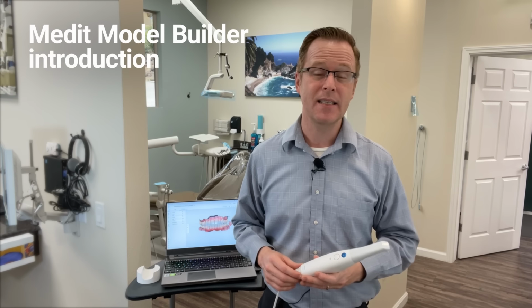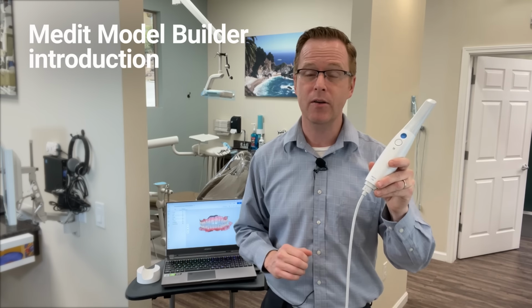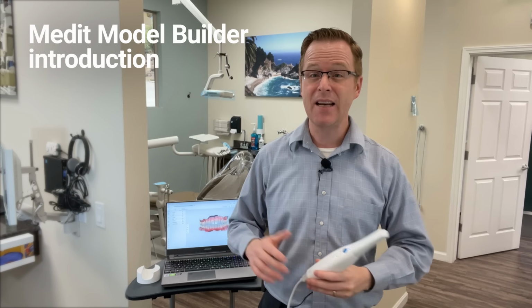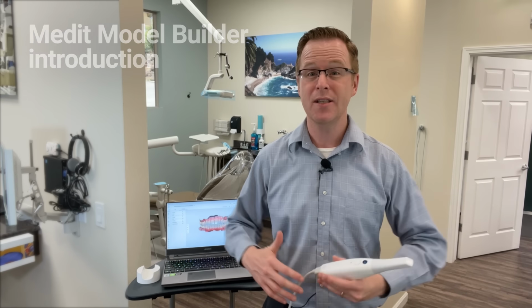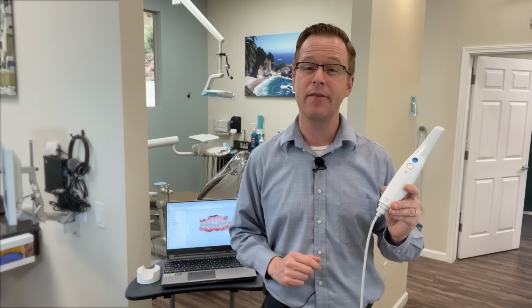What's interesting is if we think about a streamlined workflow of utilizing an intraoral scanner such as the Medit i700 and to be able to bridge it instantly with a built-in and native app into our Medit Link software such as a model builder software, we can go ahead and streamline the clinical workflow of patient in the chair to 3D printed model on my 3D printer in a matter of just a few clicks. The team at Medit has developed an innovative and unique model builder software that works within our Medit Link software for our Medit i500 or i700 scanner.